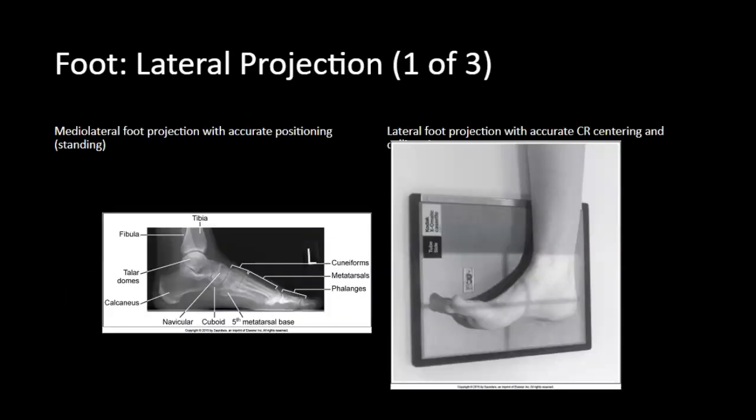Welcome to part 2 of the foot projection image analysis. We are going to go over the lateral foot projection. Image analysis guidelines state that the metatarsal heads are to be superimposed. The proximal talar domes are aligned. The tibio-talar joint space should be demonstrated as open.